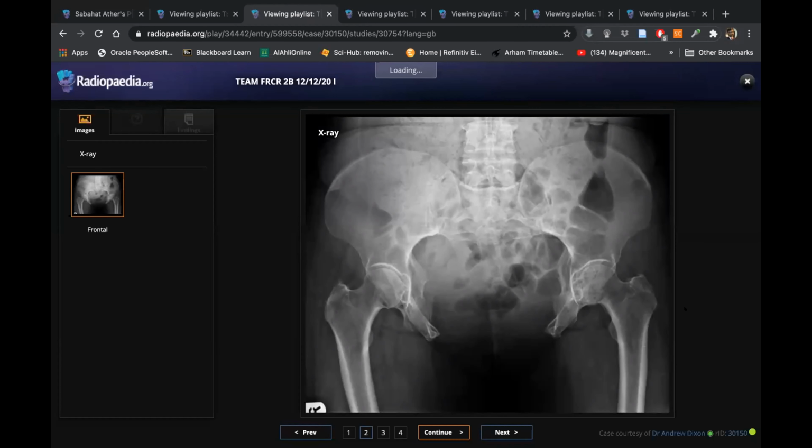Going by the appearance, this looks like a chronic problem because the pubic symphysis appears to be quite widened. Yes, because you said that we have to do an urgent referral to orthopedics. Okay, correct, so this is a chronic problem. Excellent. But the patient has left hip pain. Anything to explain it? As you correctly diagnosed, this is chronic.